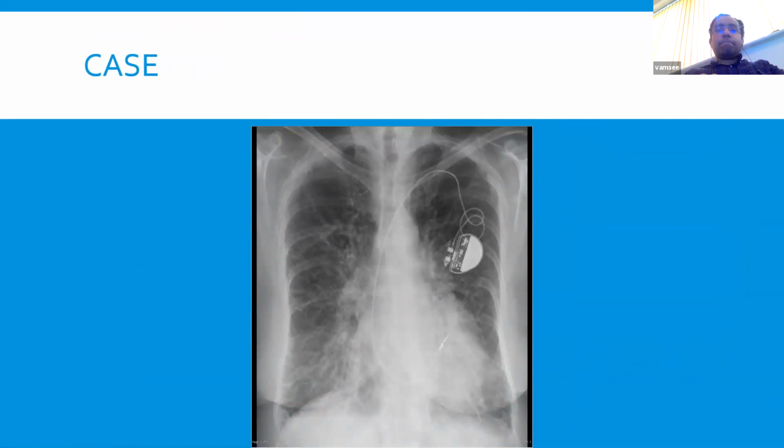Okay, now along the same lines, I've got another case here. I have 30 to 40 seconds. See what you think, and then I'll try to go through it with you. So in this case, it is another case with a patient with heart failure.